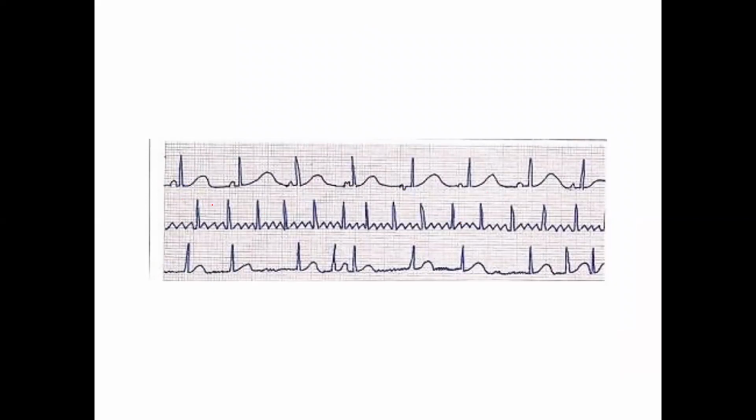This one looks regular. Let's look at the PQRS. Now we got these weird P waves, and they change every time, 30, 40, 50, 60, 70, 80 beats per minute. So what do we call this one? Well, where's the rhythm starting from, first of all? The atria. Yeah, it's atrial. It's kind of a specialized one, I guess.